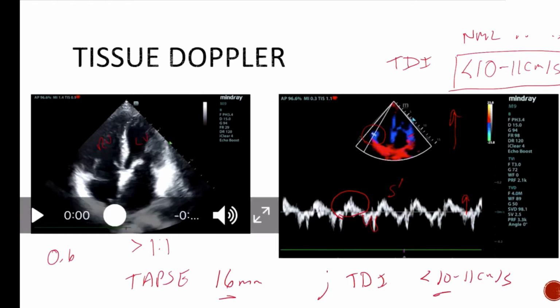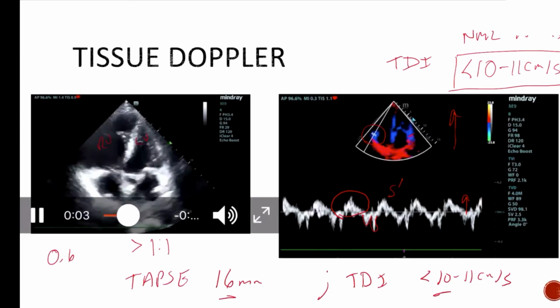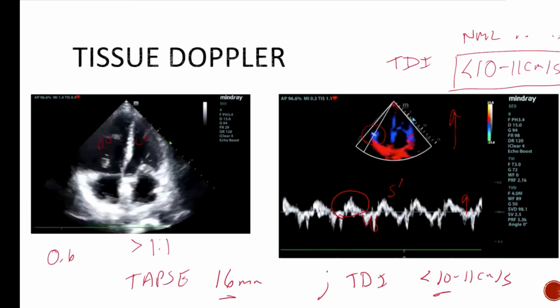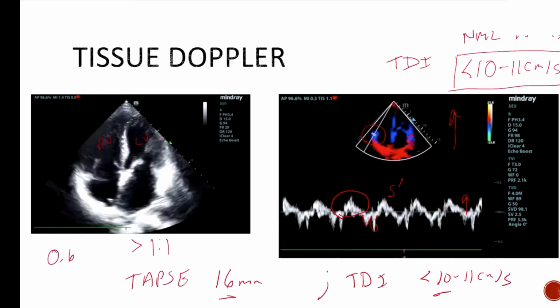We also can see here, look at the septum here. You see how that's bowing into the LV? So as the pressure in the RV gets high enough, where it's higher than left ventricular pressure, you're going to start to see this septum, which is shared by the two ventricles, get pushed over into the LV because your RV pressure is too high.